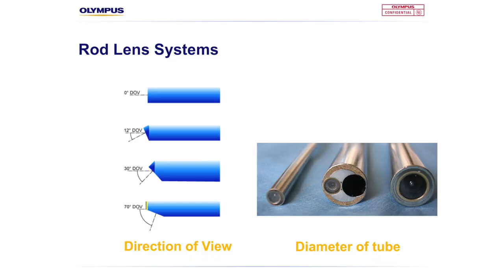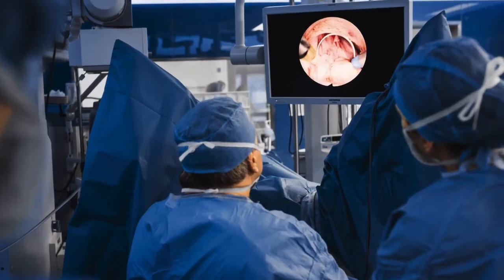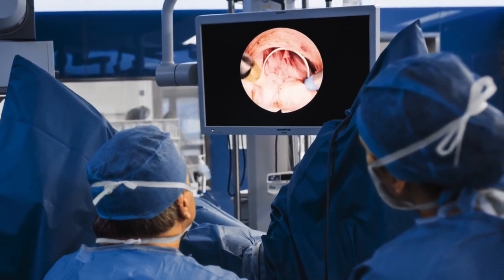expressed in millimetres. Different diameters of telescopes allow for different sized optics to be used, depending on the size of the passage or cavity which is being observed. For smaller cavities, such as shoulder joints or, for example, the bladder, a smaller diameter telescope will be required. Smaller diameter scopes produce a smaller sized image, for example, this 4mm telescope image.